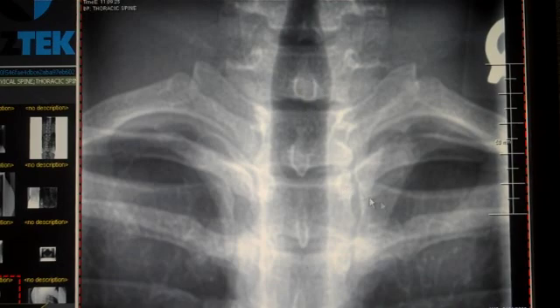You do see, of course, the top of the clavicle coming straight across right here, and here's the medial aspect of the clavicle coming across. We do see, of course, the first rib is this one, the second rib is this one, and the third rib is here. Okay? Now, when we look at this dark space from here to here, and I move my mouse intentionally, that is your tracheal air shadow, comes down, comes down, comes down. Then the dark area right out here, and you can see the edge of that lung field right along there on our close-up. You can see the top edge, and so that is your apex of the lung right there.